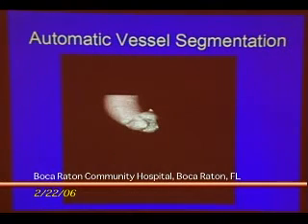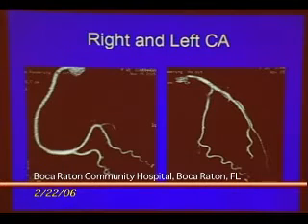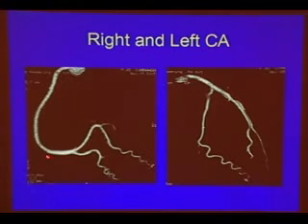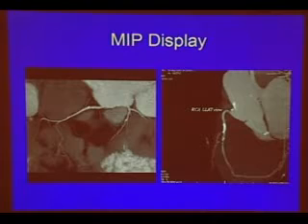We're able, again, to do 3-dimensional imaging, and essentially this is what we can obtain with a cardiac CT scanner. And essentially, I'm basically showing you the same image that a catheter angiogram would. This is actually obtained with a CT scanner, not a catheter angiogram. And it just shows that we can obtain 3-dimensional images almost as good as we can with catheter angiogram. So essentially the future is now.